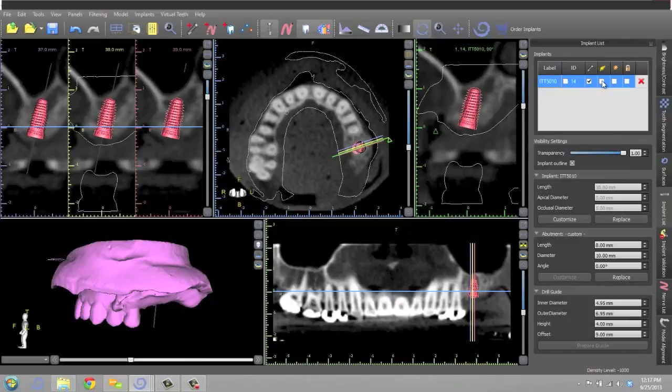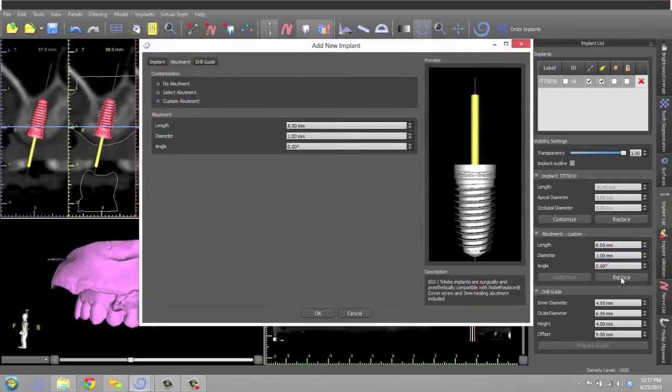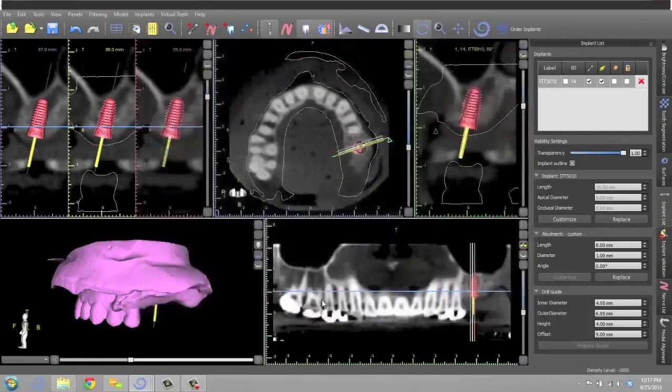This is the implant abutment. In this case, I put a 10mm abutment on this implant, and that would be down here. Now, I just highlighted that, and I'm going to put a 1, and now I use a 1mm or a 0.5mm abutment as a center line for my implant when I plan oftentimes.